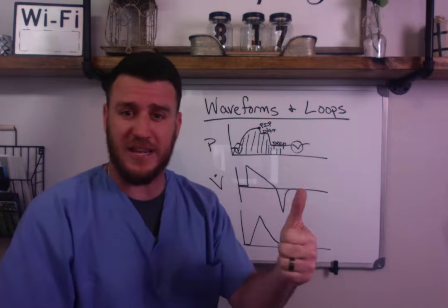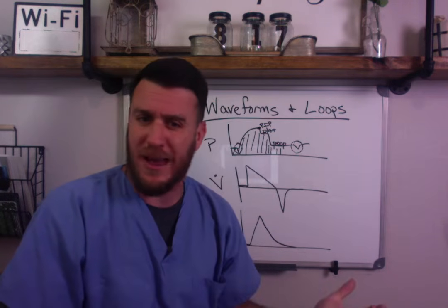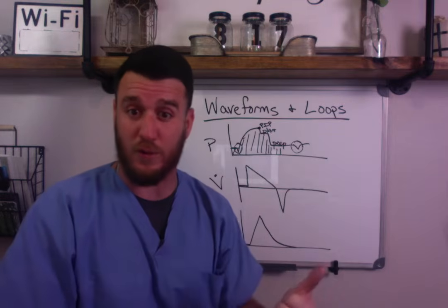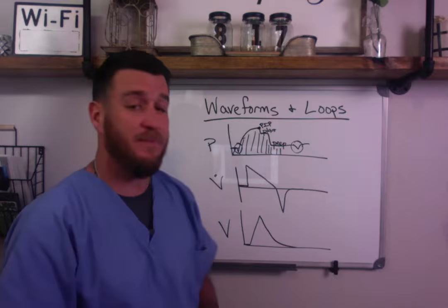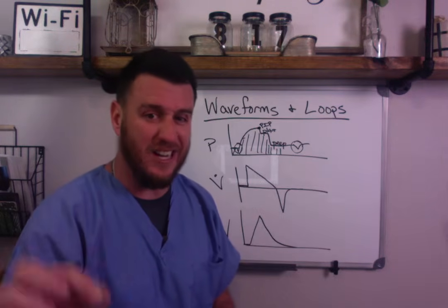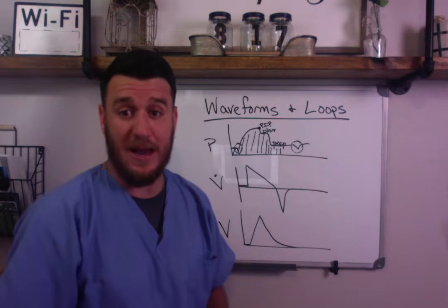Whether it's a true spontaneous or if I'm getting whatever the machine is set in AC. Doesn't matter. If I want a breath as a patient, sounds like torture if I ask for one and don't get it, right? So look at your sensitivity if you ever see a dip in the pressure waveform that isn't immediately followed by a breath being allowed, okay?